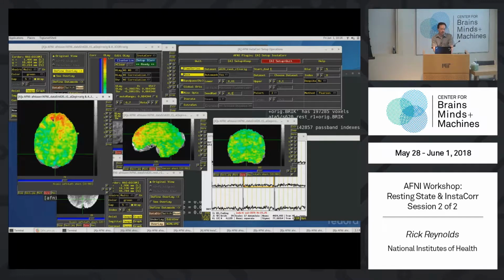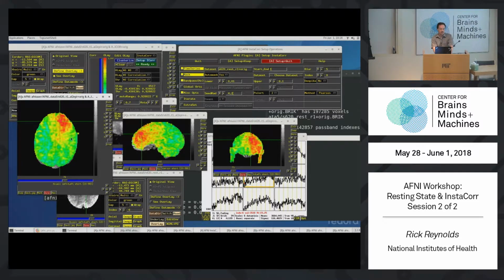And I'm going all the way up here and up on the right. And what is this? I drift up here. That does not look good. These very high correlations in a big blob that's not following anatomical structure. It's going through all the slices you can see in the orthogonal views. Even goes way down here in this coronal view. That's horrible. What is going on?